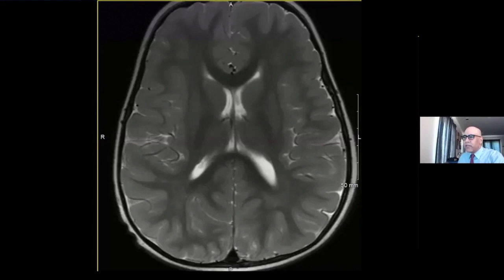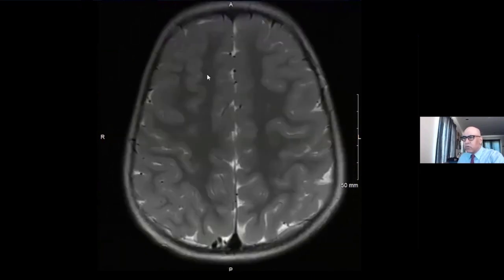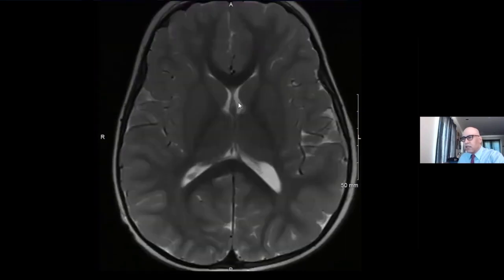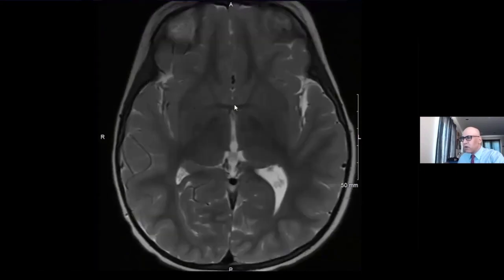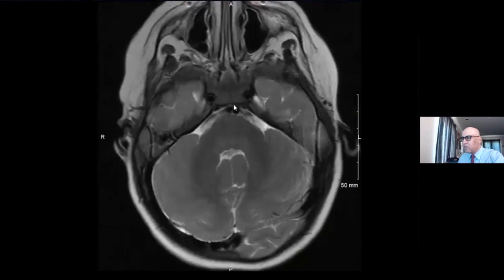This is an MRI of the brain in a 2-year-old child with developmental delay. So as we're looking, the cerebral hemispheres look fairly normal. We have good myelination that is appropriate for a 2-year-old child. The ventricular system is normal. We're not seeing any asymmetry. We're not seeing any other suspicious lesions. Now, if we get to the posterior fossa, there's something that stands out, and it can be tricky to catch if you're not paying attention because it's a midline finding, and it's in particular the absence of something.